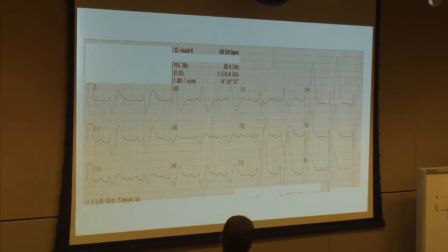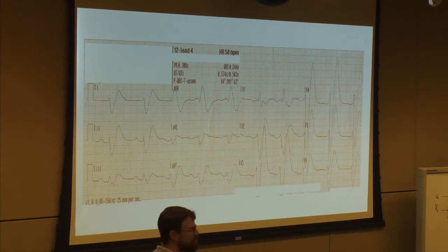Wide complex bradycardia. But, Mike, you said it, P waves. By the time I'm this far into hyperkalemia, where does my P wave go? It's gone. That's why people want to call it idioventricular. I got a nice P wave on all these. There's a good prominent P wave. So that doesn't go towards hyperkalemia.